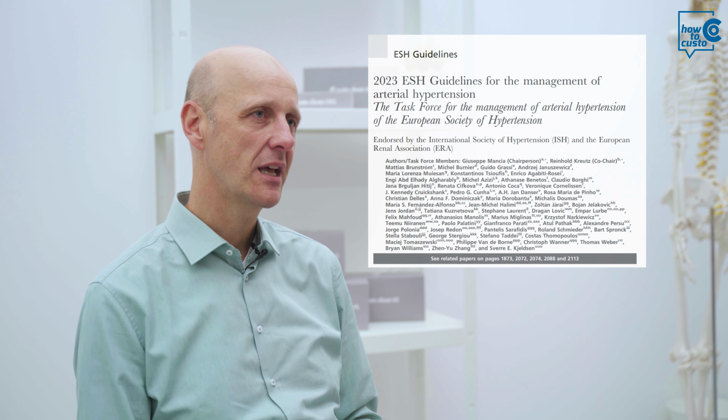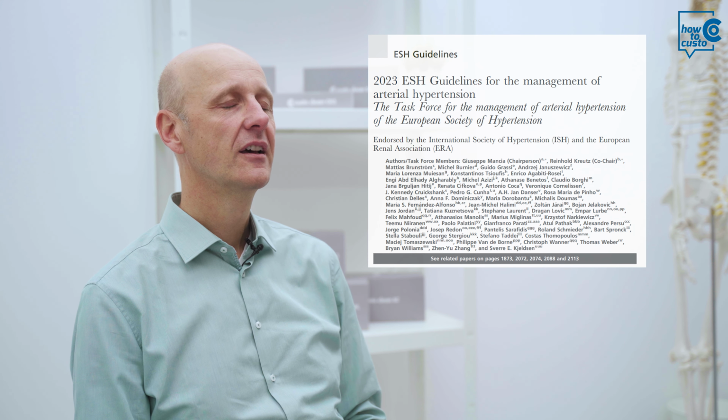Today I would like to inform you about the hemodynamic phenotypes that we have incorporated as one of the key innovations in Custo Diagnostic 5.9. The principle of phenotypes is nothing new. If you look at the 2023 guideline of the European Society of Hypertension, you will see that 10 phenotypes are already listed there.